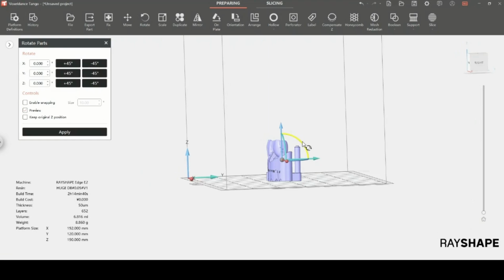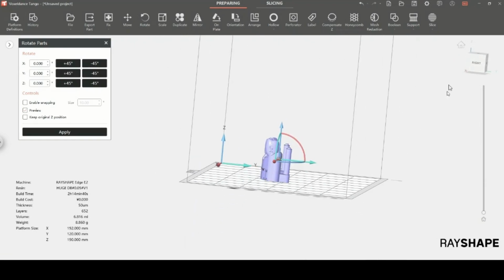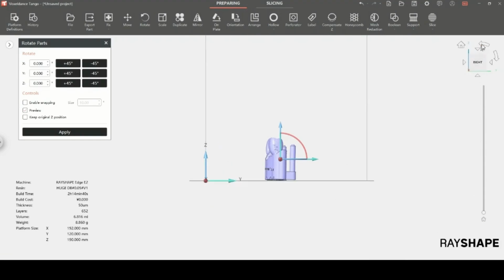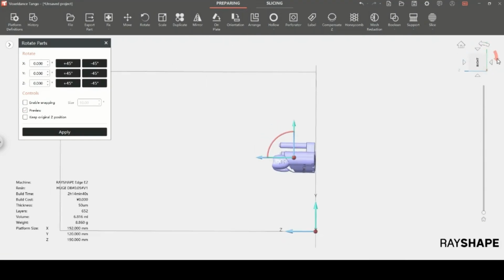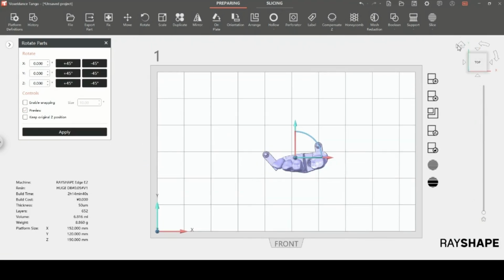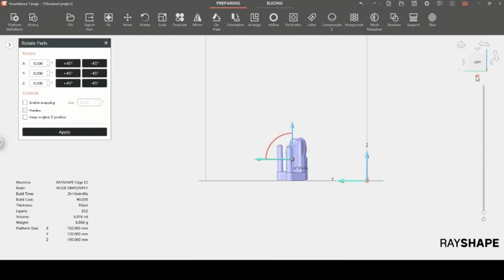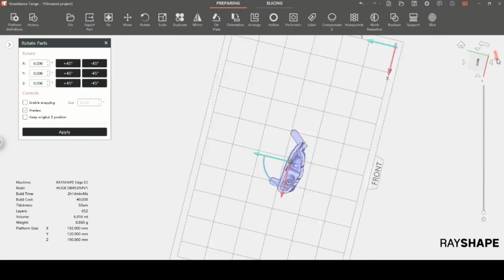Next, we're just trying to align this properly. So then we're just going to flip that over, and you can see the tubes are more synchronized. It allows you to make a more consistent turn without losing the positioning on your model.